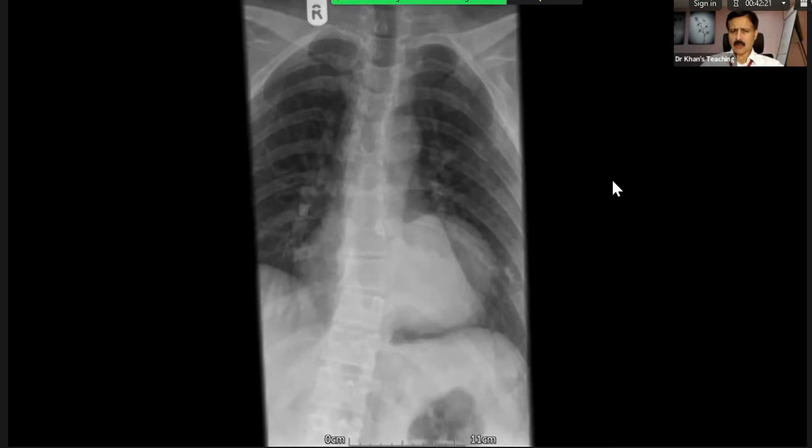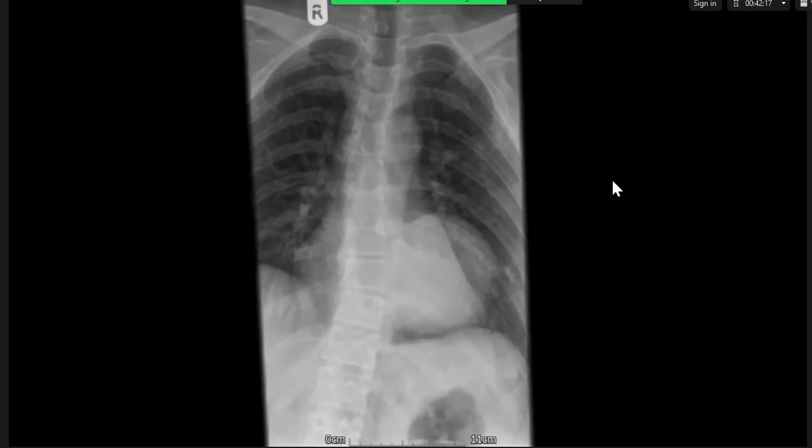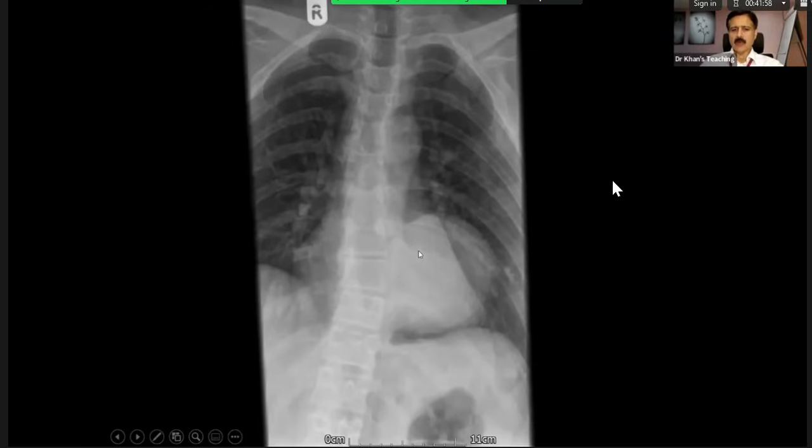Right or left? Well, left and right, really. Can you point it out to me? I'm looking, there's round here, and I think it also comes around into this sort of area, and then there's also this edge here. Okay, very good.